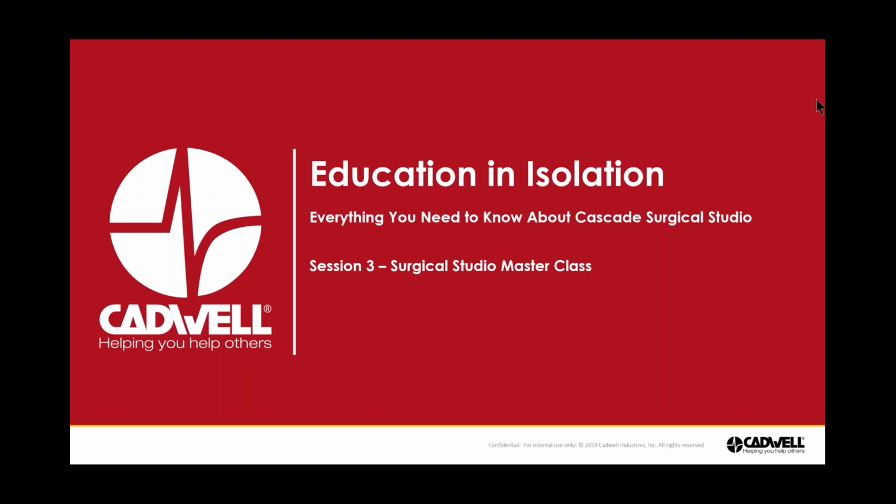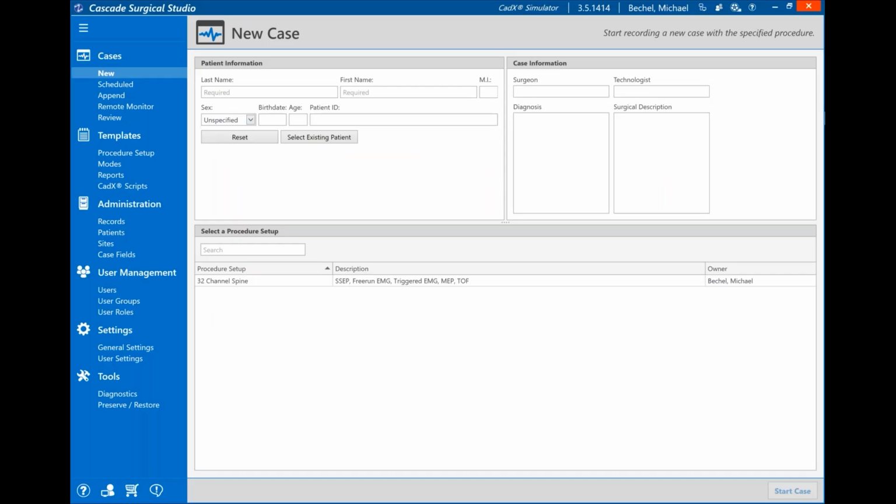Right now, I've brought up my Cascade Surgical Studio application, and we were working today with the menu on the left-hand side. We pretty much covered the case section during session 1. Templates were mostly done with session 2, and today we'll be doing the masterclass items here from administration on down.